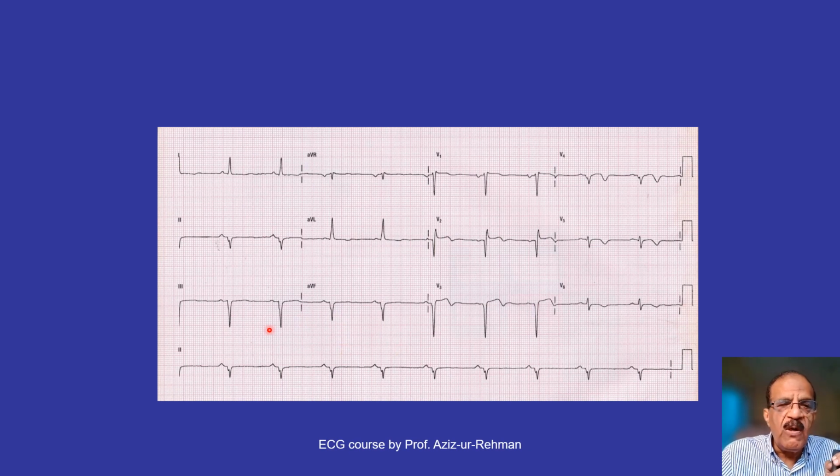Please note down that this is not actually a Q wave, because there is an initial R wave. See, in the beginning of the QRS complex, you have this very small tiny upward deflection, that is R wave. So these are not the QS complexes. These are not Q waves. This one is also not a Q wave.